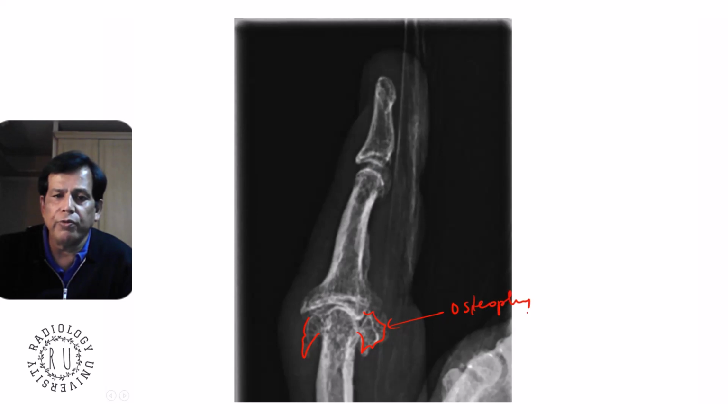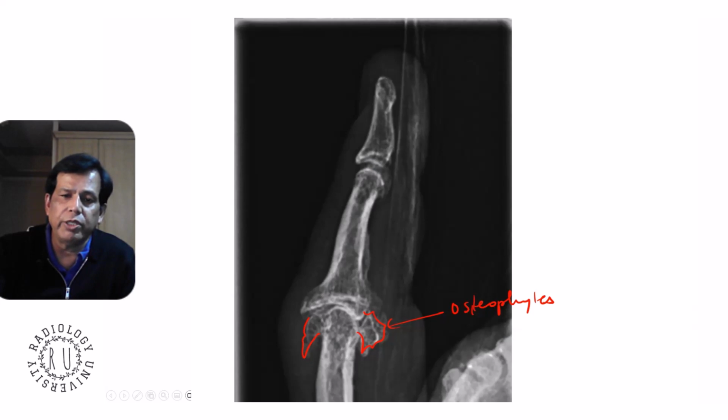This is where we can see the orthogonal view, the other view, which is very important. In a totally different view here, you can see proliferation of the bone rather than erosion. So loss of joint space with proliferation of bone and osteophyte, and then you can say what it is. We have seen the two cases; this is totally a different case, and this is more of osteoarthritis.